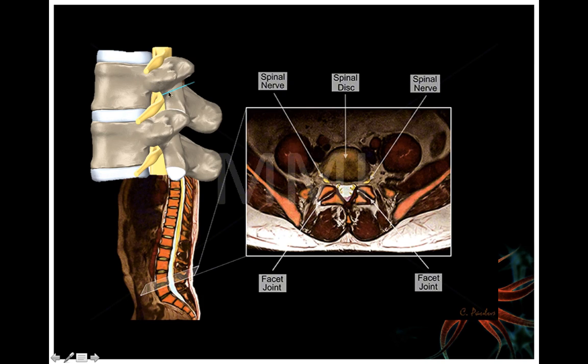You see the side view, and I wanted to show the foramen. Okay, this is the vertebral body, the pedicle through the middle here, and then you have the transverse process that's sticking out at you. You have the superior articulating process here, and the inferior articulating process and spinous process. And this is the hole where the nerve is going out. This is the hole right here where the nerve is going out. This is a side view. This is a bottom view, looking to top.